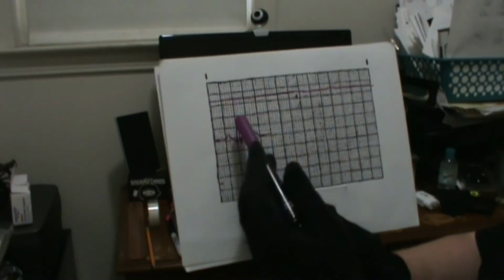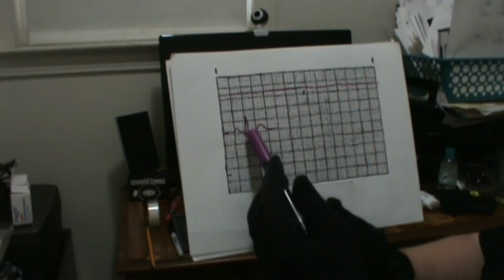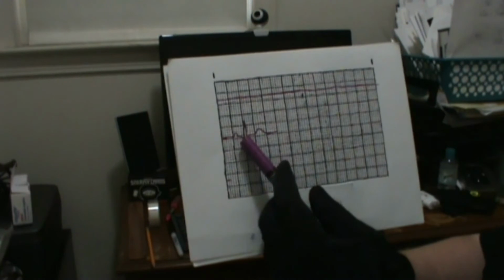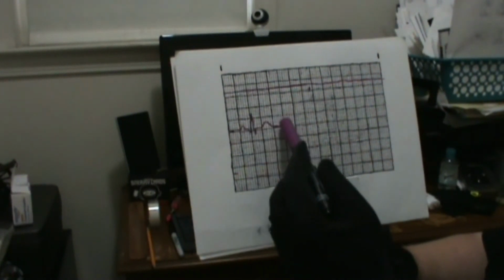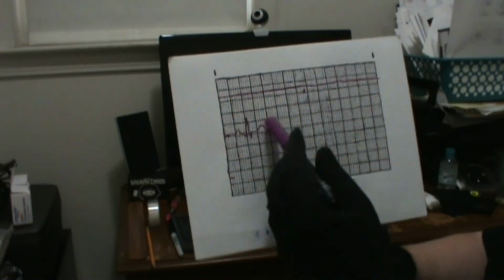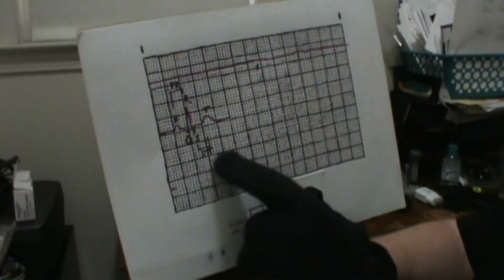Now, between the P and the QRS complex is called the PR interval. This will come in important later when we're covering heart blocks. This segment here, between the QRS and the T wave, is known as the ST segment. This comes into importance when you're looking for signs of a myocardial infarction, such as ST elevation. After the T wave, there can sometimes be other waves known as U waves, which will be right in here. If you start seeing those, that's usually a sign of hypokalemia. To review: P, QRS, T, the PR interval, the ST segment.